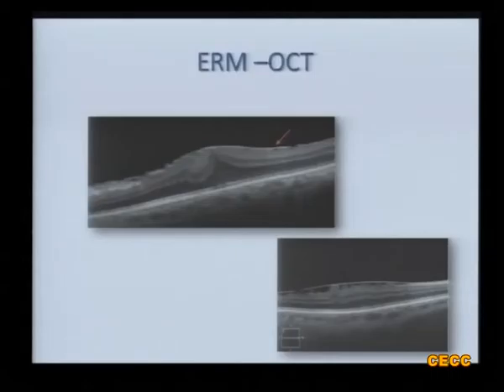And here again you can do a fluorescein angiogram. I don't think it's going to give any extra information unless you're suspecting something like an underlying CNVM. What you see in a fluorescein angiogram is the tortuosity of the vessels. Sometimes you'll be able to appreciate the leakage from these vessels also. And again here the most important investigation is OCT.